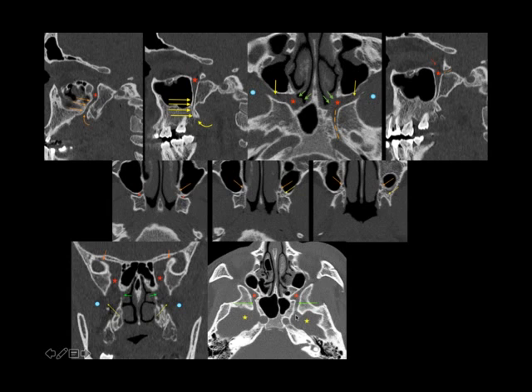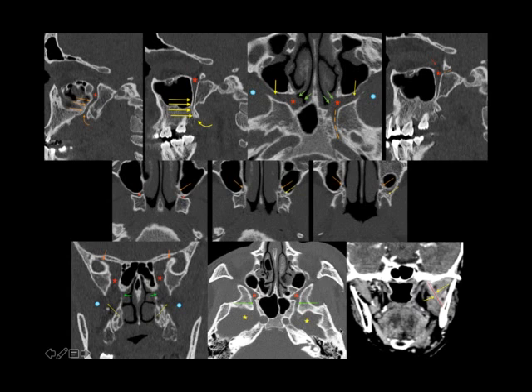What is this? Opening into. It's at the level of Meckel's cave, at the level of the trigeminal ganglion. It will open posteriorly close to the trigeminal ganglion, will take a route and go into the brainstem. So you have to see the disease spread all along the trigeminal ganglion up to the brainstem. That is the level of the foramen rotundum. Lastly, there is a structure where you can have a cord-like structure reaching up to the foramen ovale.